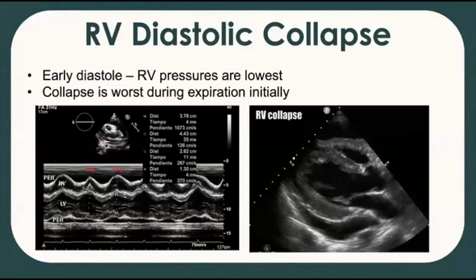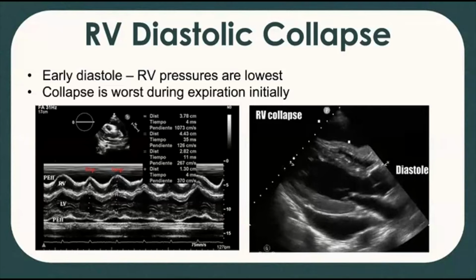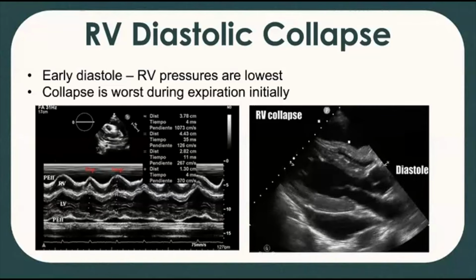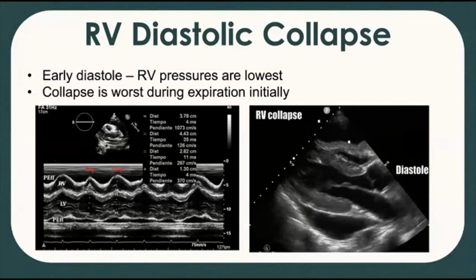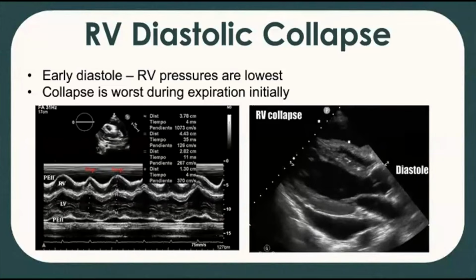There have been some experimental studies showing that right heart chamber collapse occurs earlier than pulsus paradoxus, and the sensitivity and specificity of chamber collapse improves as the severity of tamponade increases. The one small caveat to both RV and RA collapse is posterior loculated effusions, for example during cardiac surgery. You might be getting more LA and LV chamber collapse, but we'll get back to that.